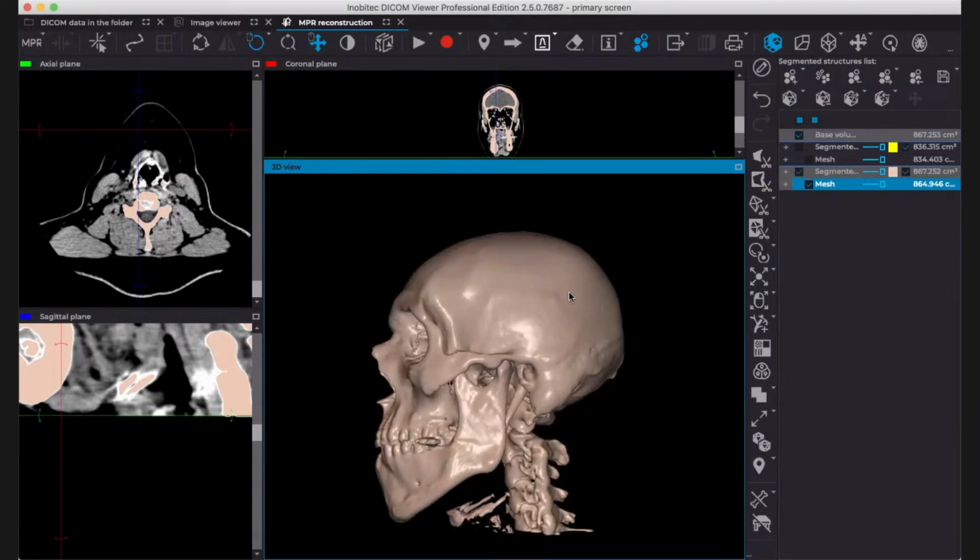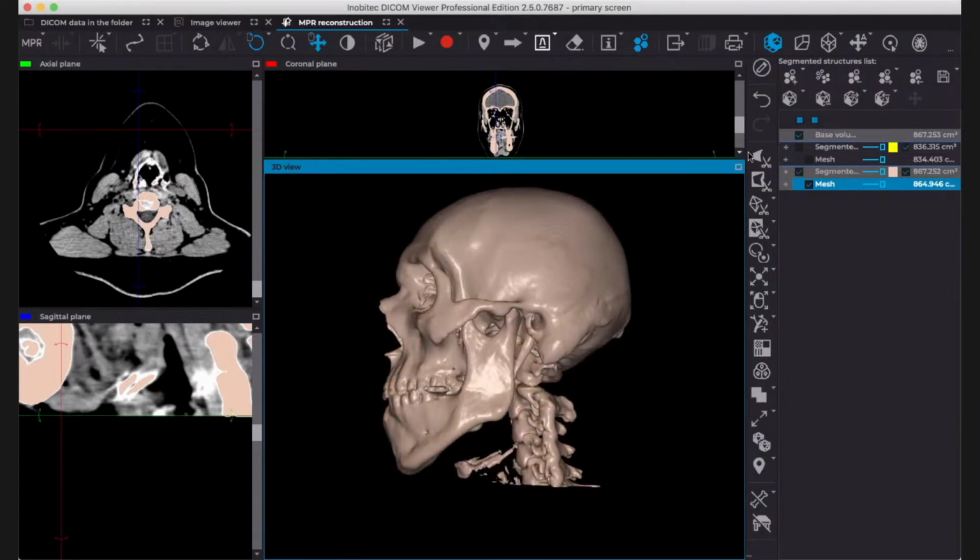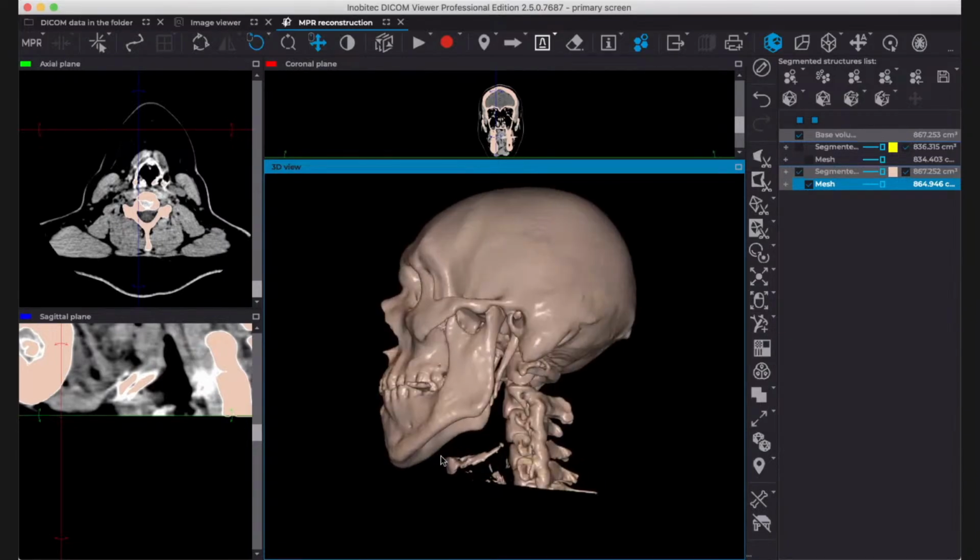And now we are gonna use some of the tools we see here. So for example, you see we have the highlight button here. Let's say I want to remove this. There are different ways of removing this part I don't want. So we are gonna use for this the first four tools here. First one is polygon cut, which means I will select the area I want to cut.